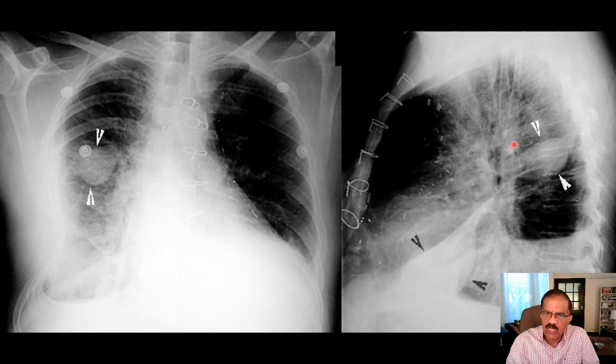And if you don't see this film, you might actually think that this is a tumor or an abscess. But if you compare this X-ray with the lateral film, it is more obvious. This spindle shape tapering on both sides. This spindle shape opacity is typical of encysted effusion in the oblique fissure. This one again, you can see the pleura, two layers separating from each other, and this is fluid, but here it is just an opacity.